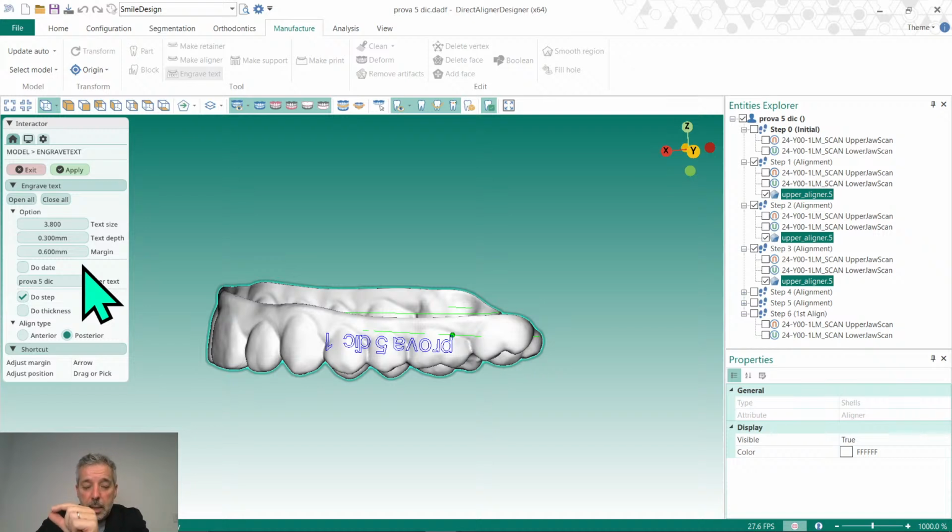the deeper, and also you put the date, or maybe some code if you want, and text, for example, like my name, Stefano Negrini, and also do the steps or not, if you want, and also thickness. Thickness 5 is 0.5 is the thickness, or maybe just the steps.